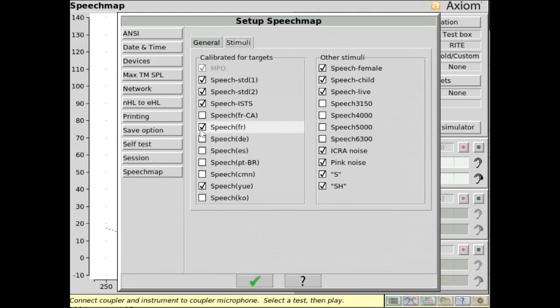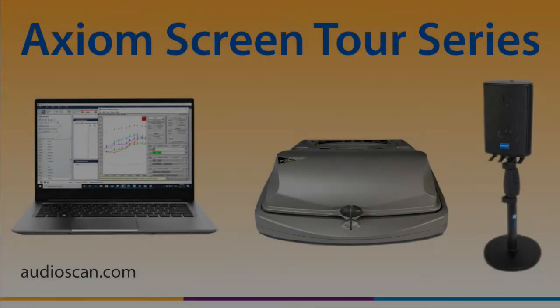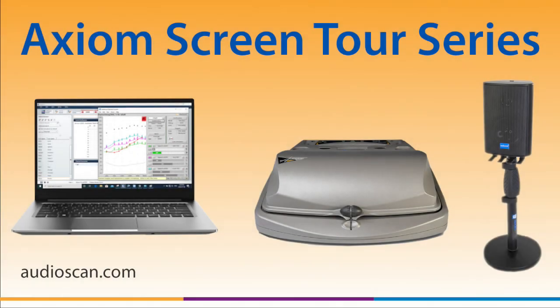SpeechMap by checking and unchecking the boxes. For more information on any of the setup options, please see the Axiom user guide.